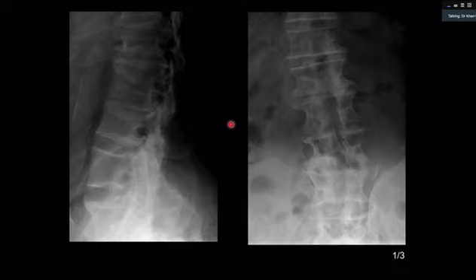So your thinking is correct, and so a slight bit of fine touch is needed. Spacing is what we are talking about. Is the spacing normal or abnormal? This is the discussion. So if you see the distance between this pedicle and this pedicle, versus this pedicle and this pedicle, it gets progressively narrower as opposed to getting progressively wider. So have you got your diagnosis then?